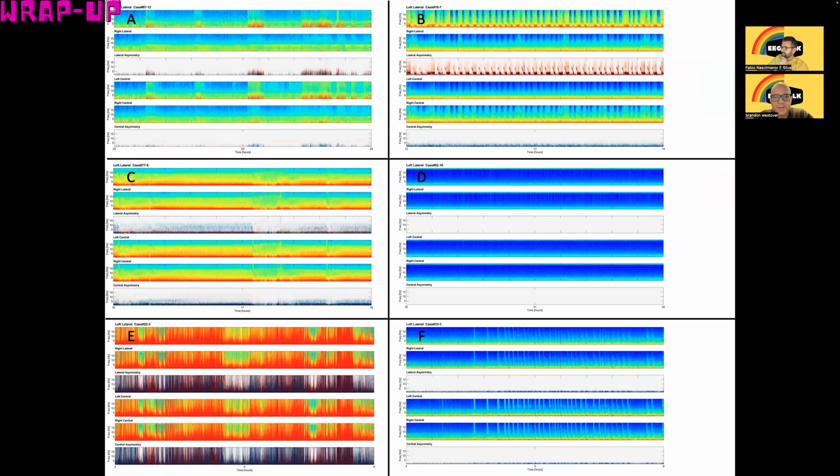All right. So just to wrap up, we're showing the different patterns that are useful to know to infer what's in the EEG. Let's take the B first. You can see there's 1, 2, 3, 4, 5, 6 panels in each thing here. We're going to ignore panel 3 and 6 because those are asymmetry spectrograms, and we haven't talked about those. B is an example where there's a whole bunch of little flames on the left side.